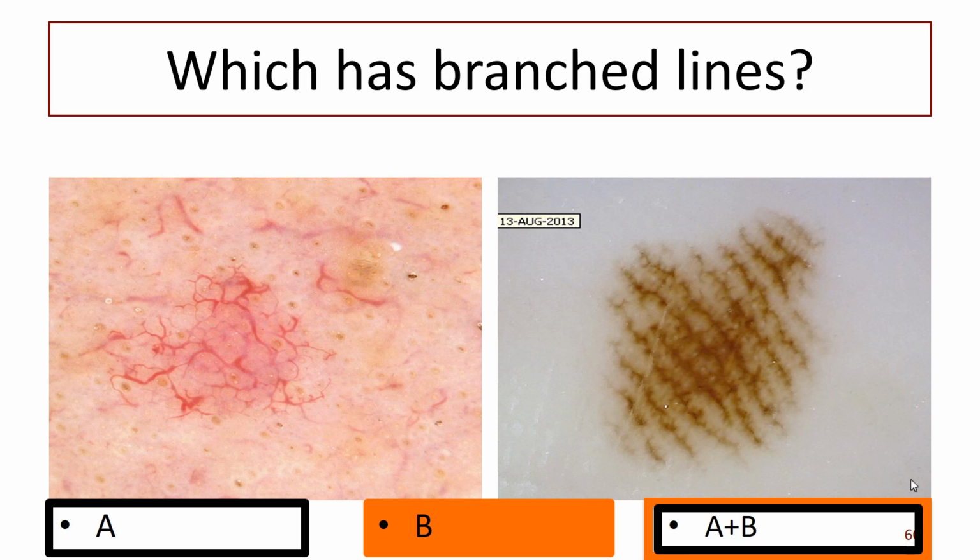Can we have a picture of a branched line up there? Thanks. Perhaps in red? So this isn't a diagnosis, it's a pattern. Same as this is a pattern. Now, these are parallel lines, and we'll come to parallel lines in a minute. Would you like to make any other comment, Michael, about these lines on this one? It is an acral nevus. Parallel in the furrows, so that means they're going along that way, between the ridges. Yep.